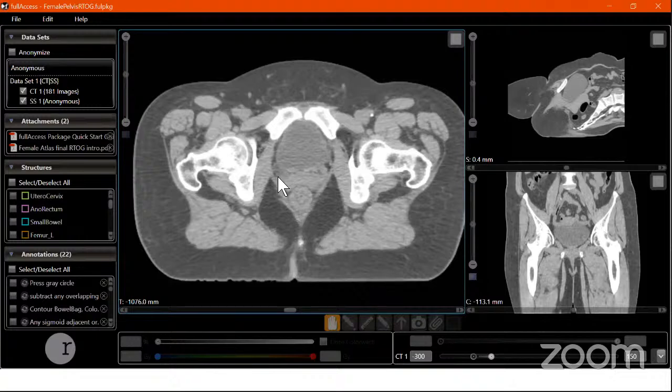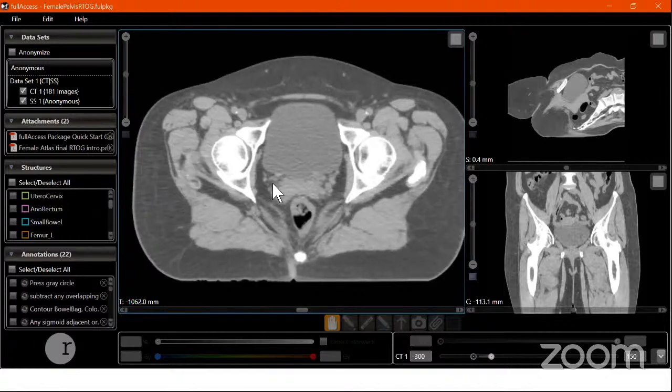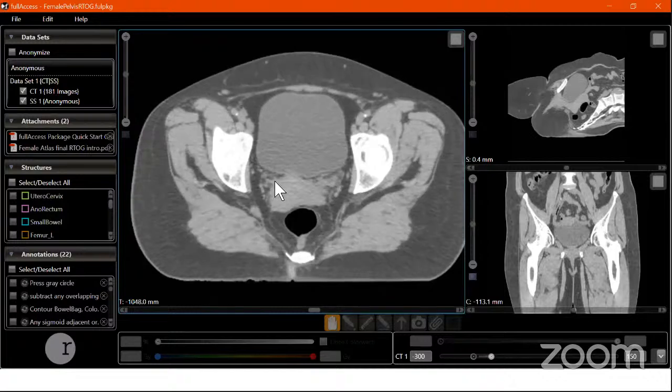So obturator node and the internal iliac group of nodes are going to share some common volumes, of course. And this is about the nodes following the common iliac node, nodes following the external iliac, nodes following the internal iliac, and the modification that we required for this.